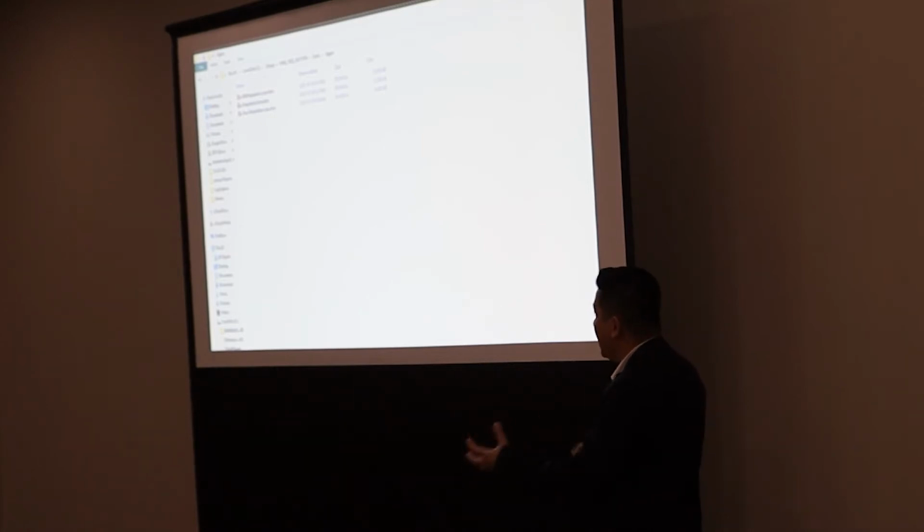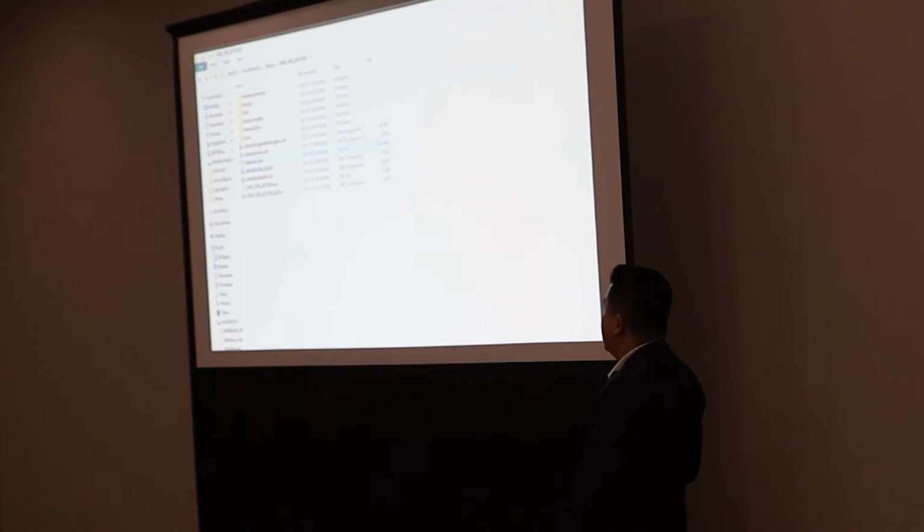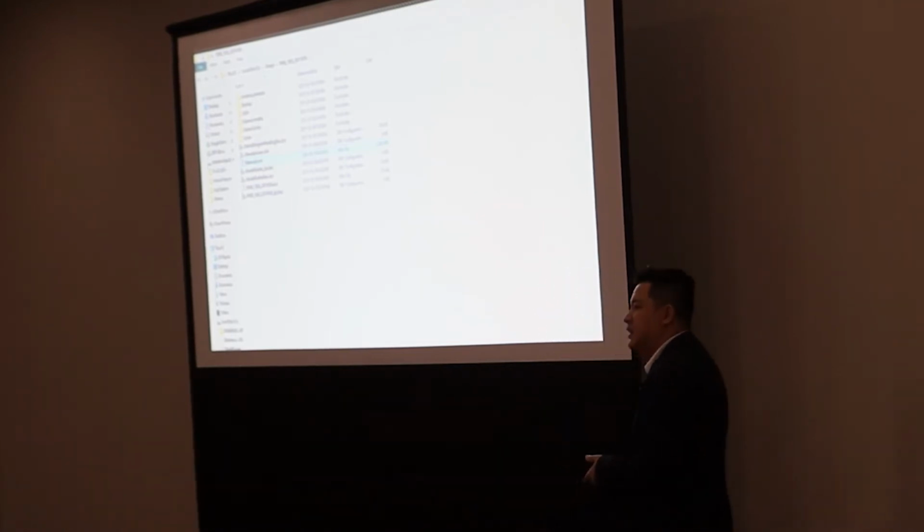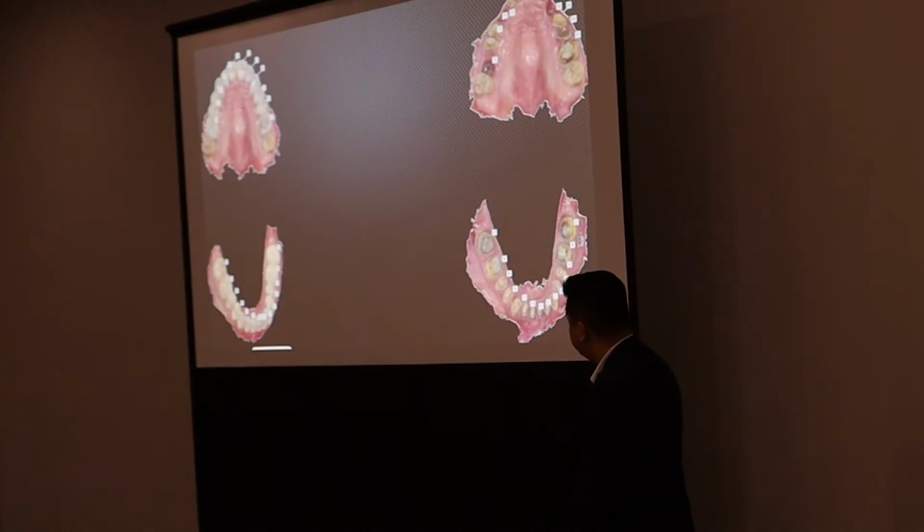So if you need to rename or move things around, we'll kind of show that as well. The last thing, the only other one that I really focus on is materials.xml. This one is not really important in most workflows, but primarily with implants. If you need to modify some kind of values inside of materials.xml to allow that implant to proceed and generate a CAM, sometimes you need to modify this file.